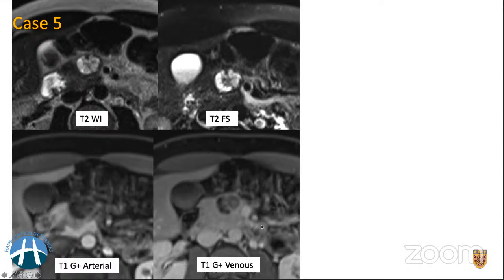So what happened on this MRI was that we gave a bunch of differentials. I'm going to ask you to write your differentials in the comment section, and then I will show you what happened to the patient next. So a multicystic or cystic mass, and on the post-contrast phase, this one is showing a delayed kind of enhancement. So you can type in your responses.